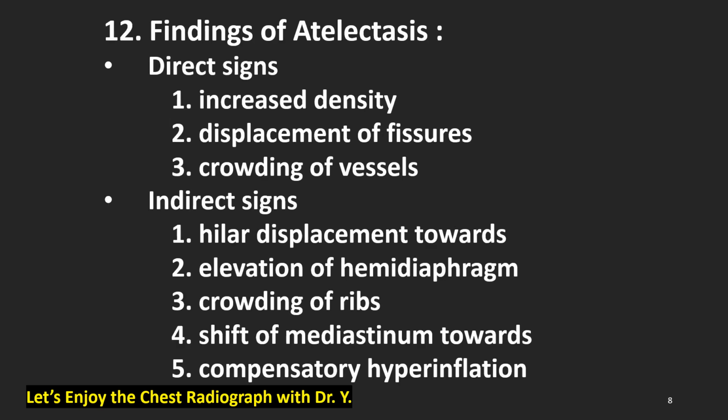Radiographic findings of atelectasis. Please remember these signs when you see the films. Direct signs: 1. Increased density. 2. Displacement of fissures. 3. Crowding of pulmonary vessels.